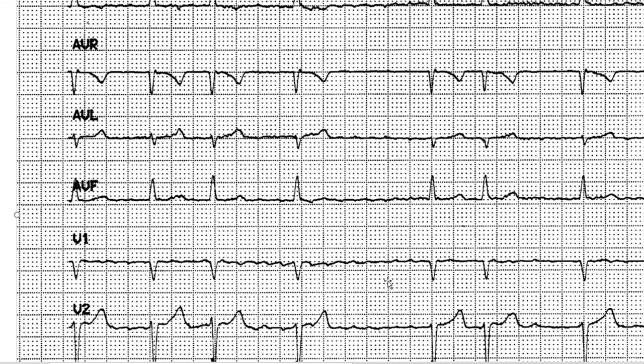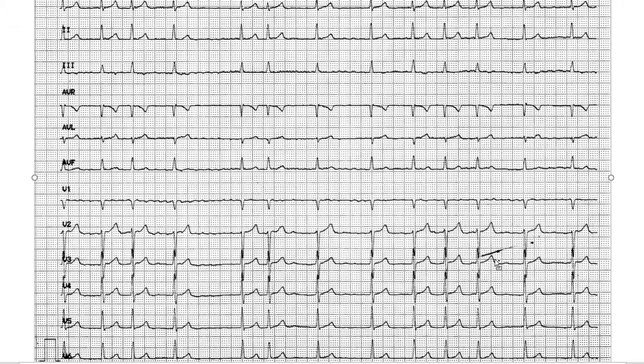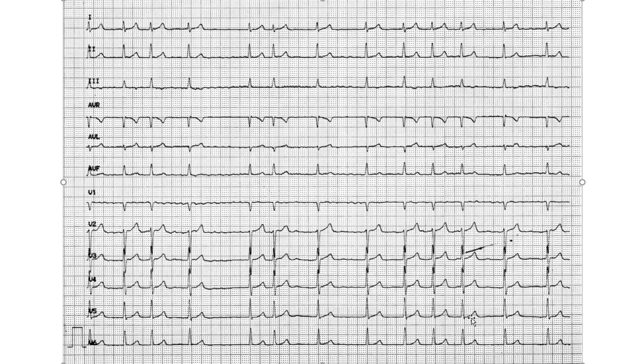So let's see. 1, 2, 3. It is about 3. You could say that it's about 3. And now you can see more clearly that these peaks are definitely not P waves. 2, 3, 3 or 4, something roughly 3 or 4. But again, it doesn't really match the picture of flutter. So it is safer to say fibrillation, because flutter typically has a sawtooth appearance, and the frequency here also suggests that it's more likely fibrillation.